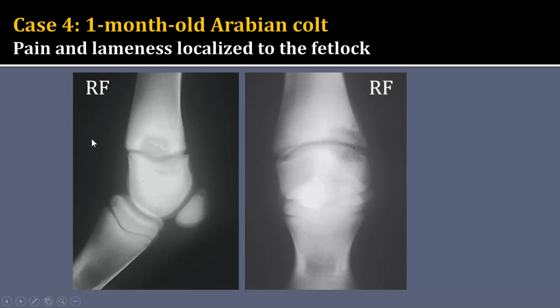As I look more closely, I see one other abnormality that's important. On the lateral view, when I look at the area of lysis in the distal metaphysis, I see this very linear, sharply marginated, and very opaque piece of bone. So when I look at all of these things in combination, my conclusion is that this focal area of lysis centered on the physis is very consistent with a region of hematogenous spread of bacterial osteomyelitis, and this very opaque linear piece of bone here is very consistent with a sequestrum. So this patient has bacterial osteomyelitis with sequestrum formation.